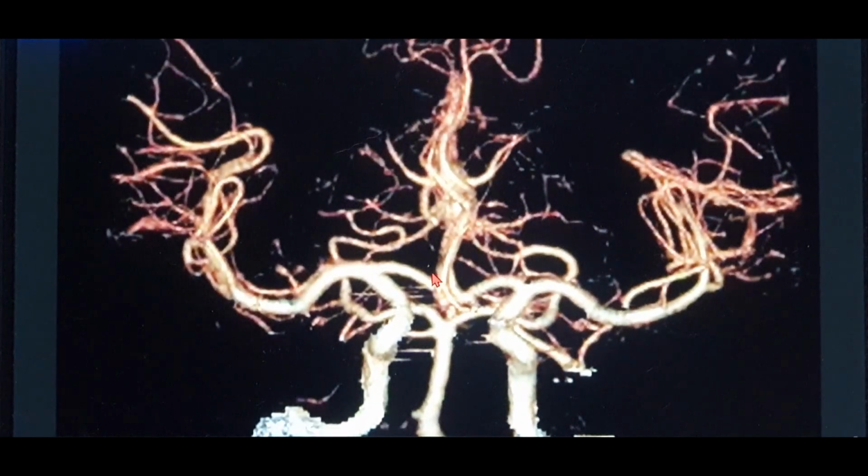So this is how the entire internal carotid artery system is studied for clinical applications like angiography. You can use this to locate any plaque, any atherosclerosis, any luminal narrowing, for transient ischemic attacks, for stroke, to locate the area of stenosis, for embolism. You can use all these applications for this.